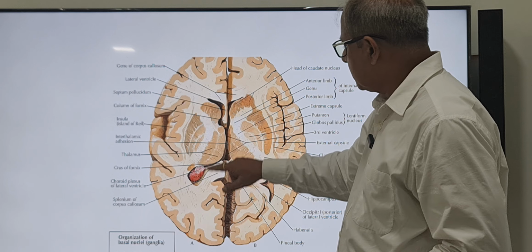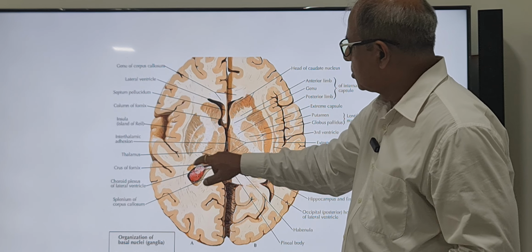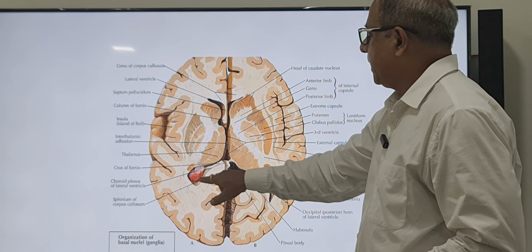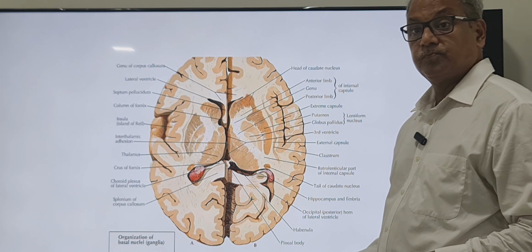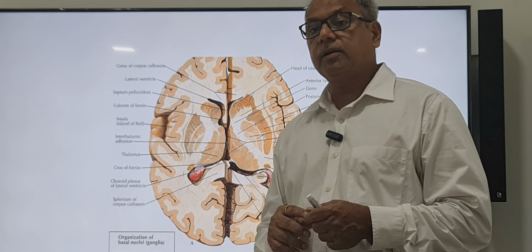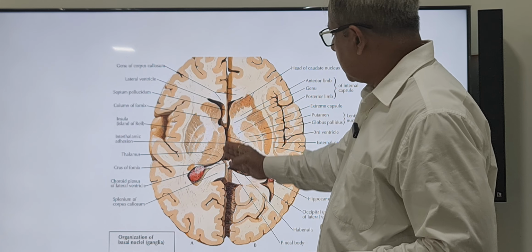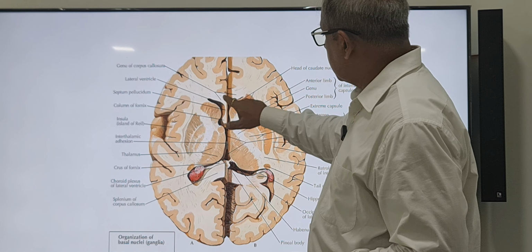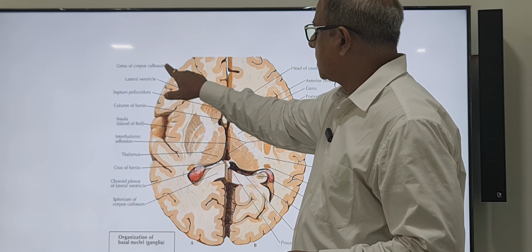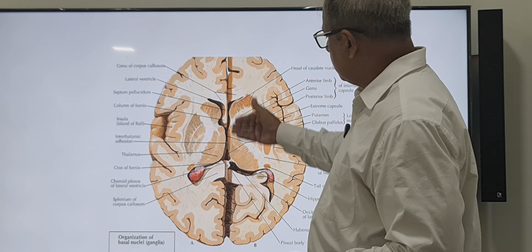And these are all thalamus. If you see, this cavity is going behind. In this lobe is the lateral ventricle. This area is the atrium, where we measure the atrial width, the lateral ventricular width. And when you go down, this part is connecting the two hemispheres. This will be corpus callosum, and this is the corpus callosum. So the corpus callosum is going like this.